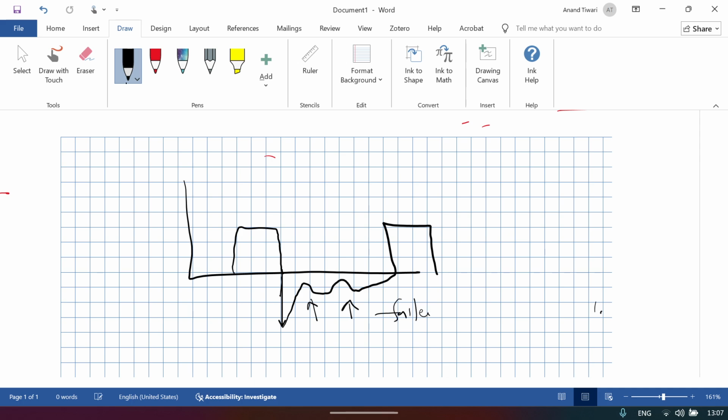So these are failed triggers because you have kept the inspiratory time short, but the patient's neural inspiratory time is prolonged. That's why newer modes like neurally adjusted ventilatory assist are supposed to improve synchrony. So you can see the asynchrony problem here, wasted ventilation, failed trigger, because of the short inspiratory time, and the actual neural inspiratory time of the patient was prolonged. So this can also be depicted from the flow time curve.